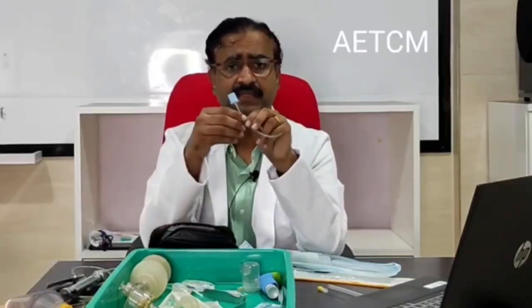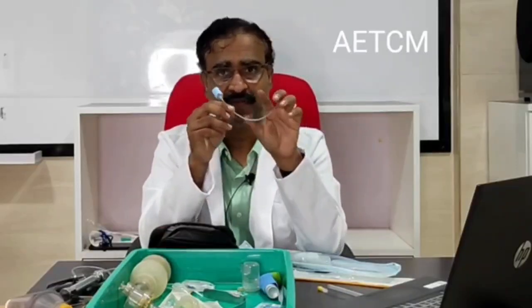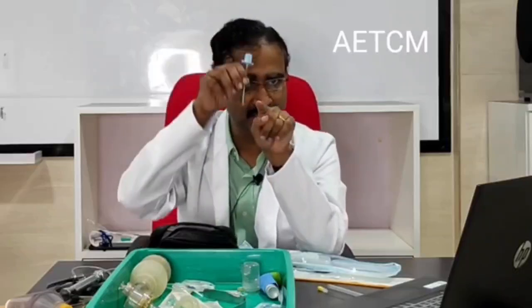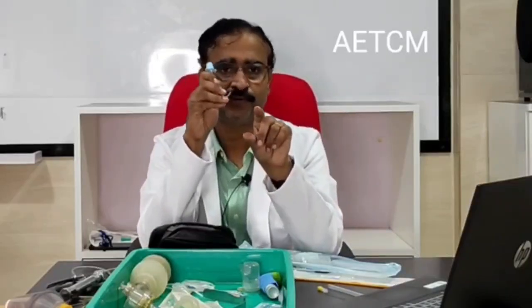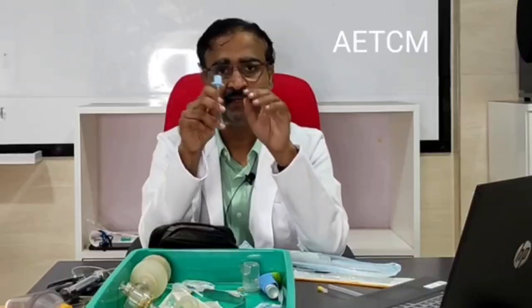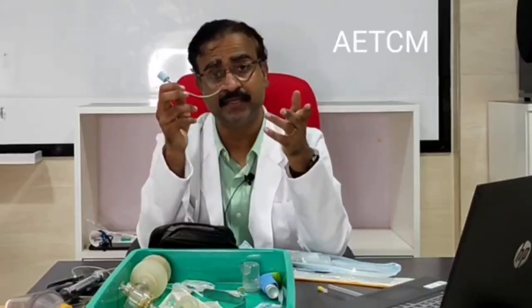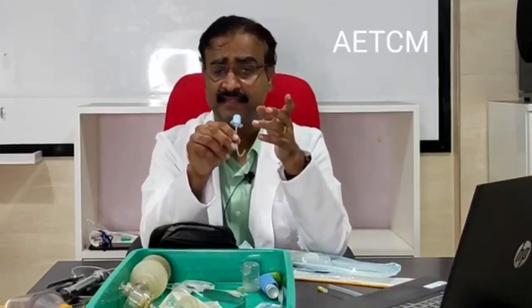At times, this tube needs to be inserted with the help of a stylet, because the airway can be directly visualized and your tube may go in and turn away. A stylet will make this a little straight, and so it helps you to very easily go in. Otherwise, if you hit any structure on the side by chance, it may actually bend away. So there is a small likelihood. To prevent that, you can use a stylet. For older children, you can also use an apparatus called a bougie. This will help you to guide and enter the vocal cords.